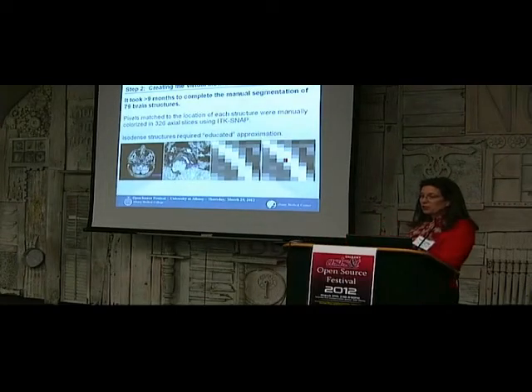So it took Joe Rosell about 9 months to complete the segmentation. The thing we learned about ITK Snap, as powerful as its automatic or semi-automatic segmentation capabilities are, is that it's not good enough to segment, that is, to delineate individual anatomic structures when the intensity of the pixels at the boundaries are not different enough. If there are isodense intensities, and you know the structure is in there, you have to go in and manually segment it.